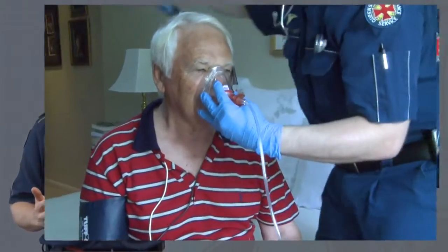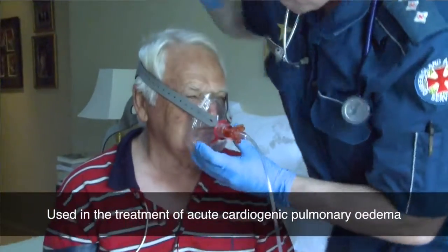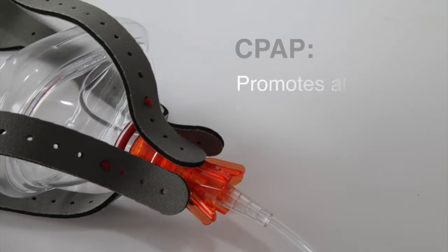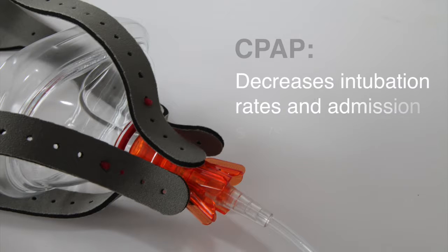Continuous positive airway pressure, or CPAP as it's commonly referred to, is a form of non-invasive ventilation used in the treatment of acute cardiogenic pulmonary edema. CPAP promotes alveolar recruitment, improves pulmonary gas exchange, decreases the work of breathing, and is associated with decreased intubation rates and also admission stays in hospital.